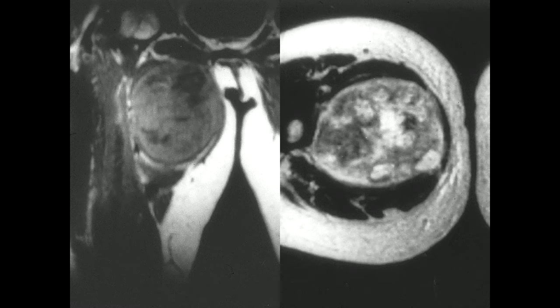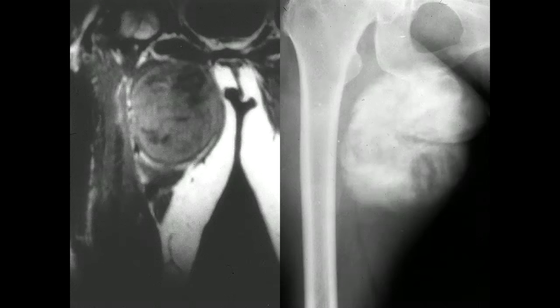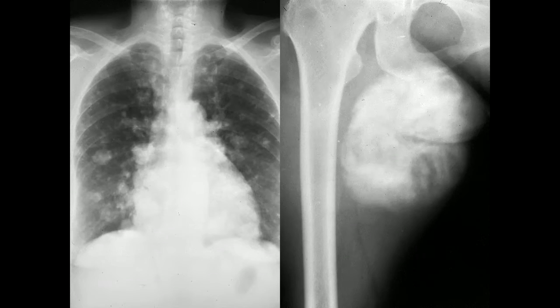But as with history, radiographs can be incredibly important because when we look at the radiograph in this patient, we see this cloud-like area of increased opacity in the medial aspect of the thigh, certainly typical of what we'd see with an osseous-producing tumor, allowing us to make a diagnosis with great confidence of an extraskeletal osteosarcoma, a lesion that we know has a very guarded prognosis, and this patient succumbed to metastatic disease approximately 6 months later. Again, just pointing out the importance of the initial evaluation and processes such as radiographs in that evaluation.